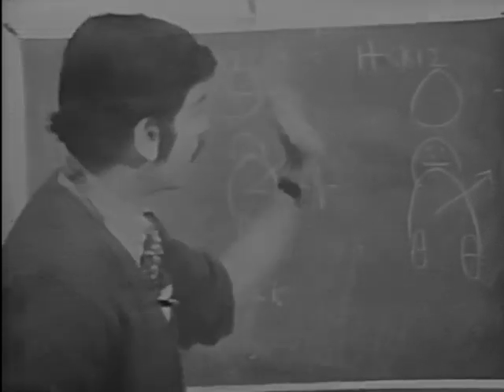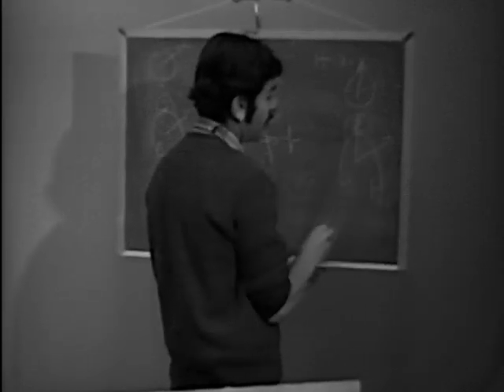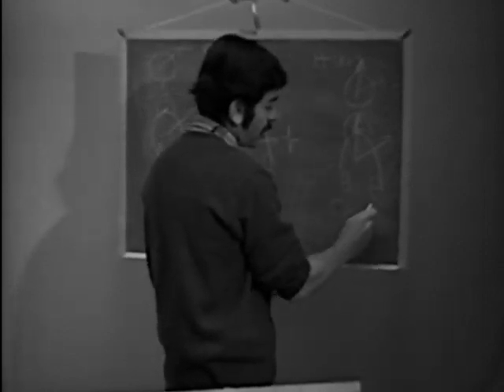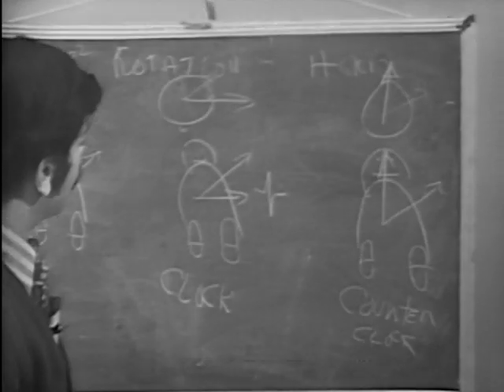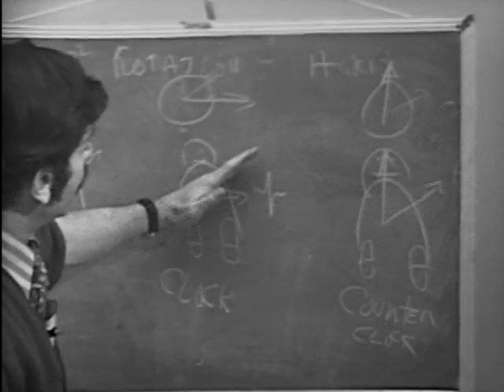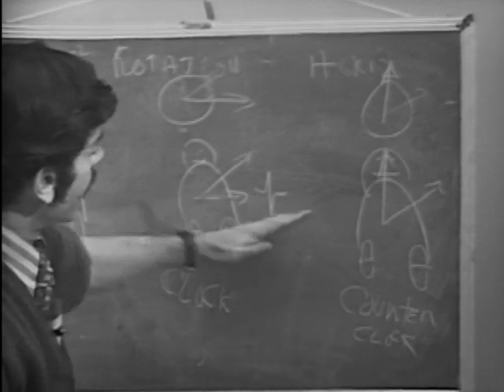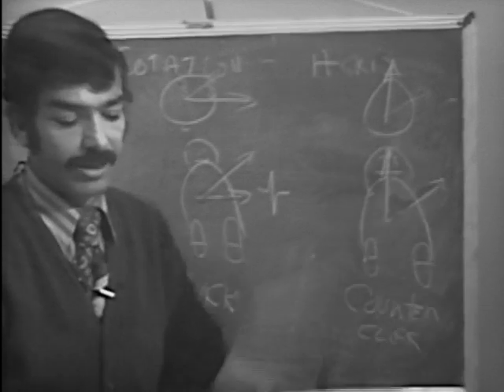Counterclockwise rotation, going just the opposite direction. We started off here. This is normal. And this patient, he's isoelectric in lead V1. Isoelectric in lead V1. Shifted counterclockwise. So this would be counterclockwise rotation. So our isoelectric lead has shifted from a normal position, which is around V3, in clockwise rotation out to V6. In counterclockwise rotation, it shifted from a normal position in a counterclockwise direction towards lead V1, and the isoelectric lead then may be in V1.